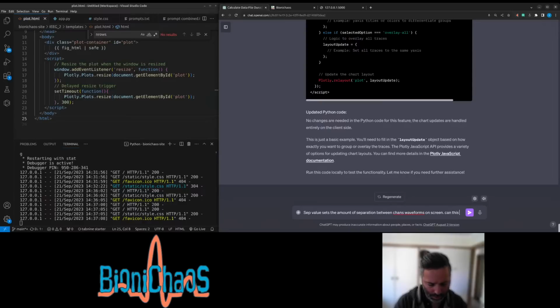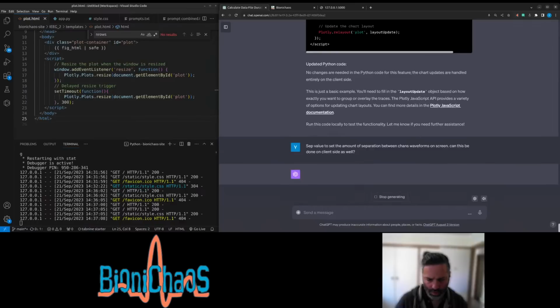Can this be done on client side as well? To set the amount of separation between channel waveforms on screen.